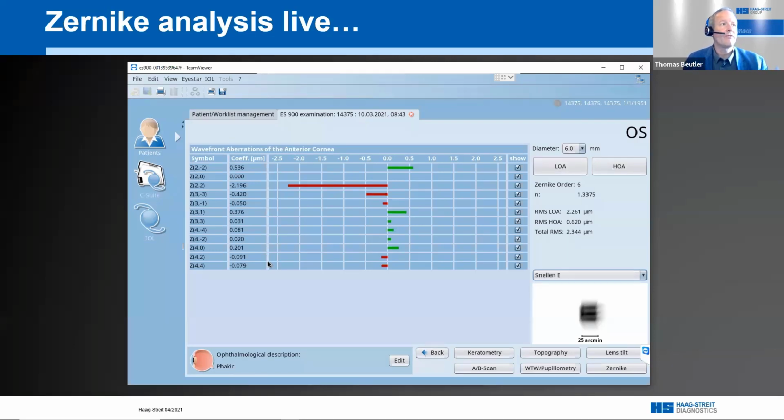So for example, here, if we say, well, we put in, let's say, an IOL that has got some negative asphericity to compensate for this 0.2 positive. What we could see if we just do this, it doesn't really help a lot. So we have now an even worse situation here on top of the Snellen E, and we lose again contrast. So it's not always just one thing you look at. You always have to look at the complete symphony of the coefficients.